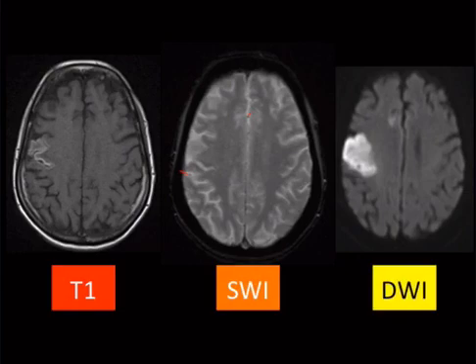So we got bright stuff on T1. That's blood, right? Just talking about petechial hemorrhage. Is that petechial hemorrhage? So remember I said there were 3 reasons why a hemosiderin sequence will be shown on multiple choice. 1 was amyloid.